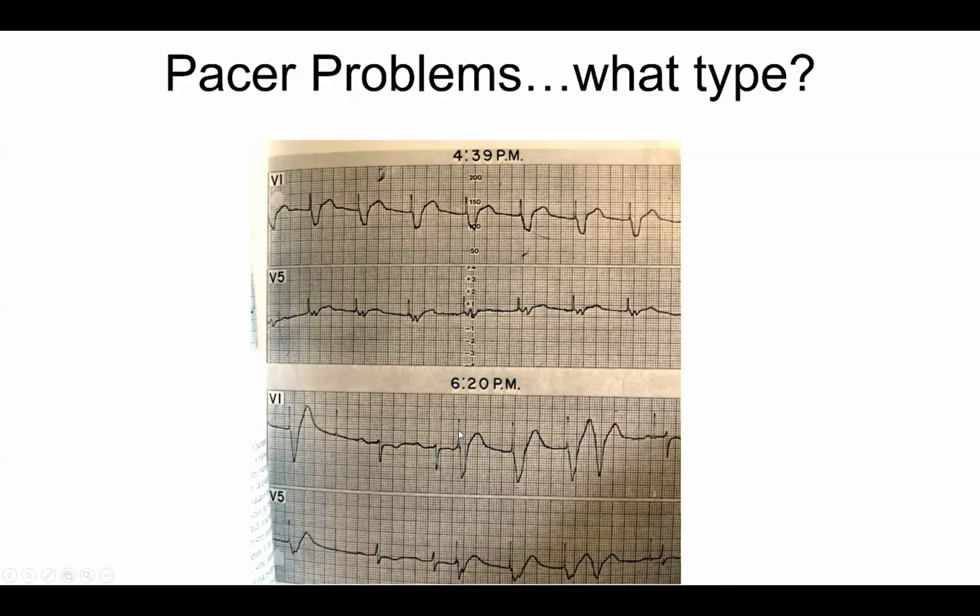Does feel like there's a paced complex with the QRS. Yeah, it's very close to the previous beat. I think the pacemaker has low sensitivity, so it's not sensing the heartbeat. The proper way to say that is to say it's undersensing, right? Right.